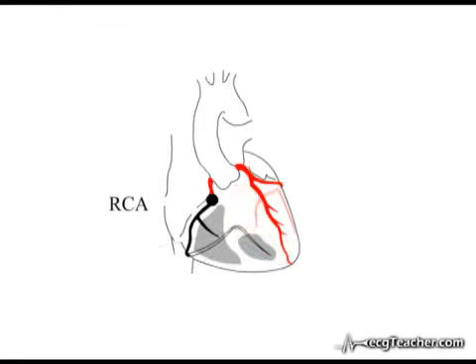Determining the presence or absence of extensive right ventricular involvement in ST elevation MI is challenging, but is of great clinical importance. For those interested, we will discuss the diagnosis of ST elevation MI in ECG blind regions of the heart in the quiz section.